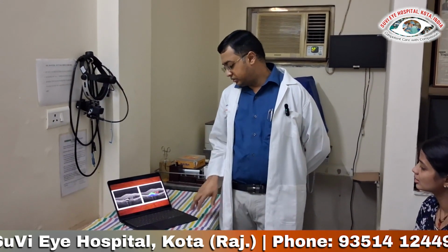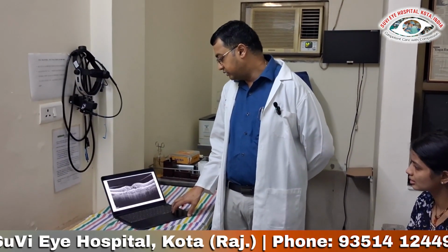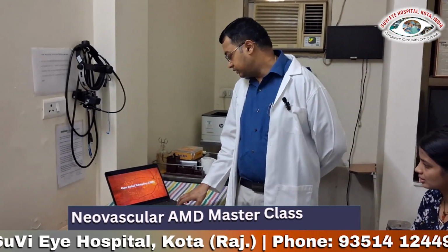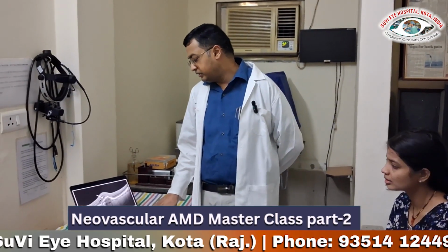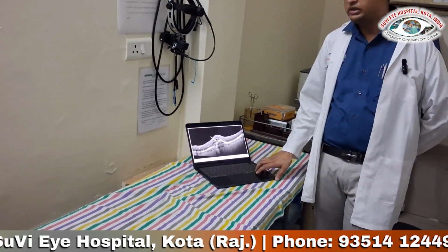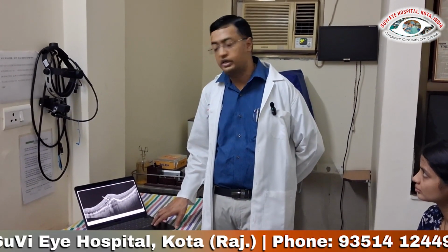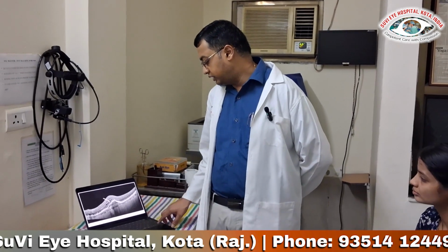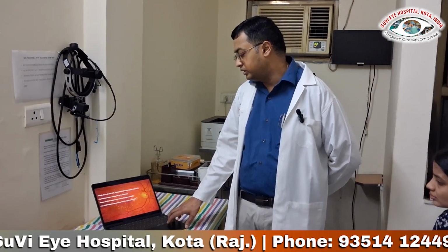Okay. Now coming to choroidal biomarkers, hyperreflective dots we discussed about. Hyperreflective dots will mean it's an inflammatory biomarker. It has a poor prognosis, and if it is sometimes associated with SHRM, some consultants have even tried addition of a small amount of intravitreal triamcinolone for that vascularized SHRM. Otherwise, there is no role of intravitreal triamcinolone for CNVs.